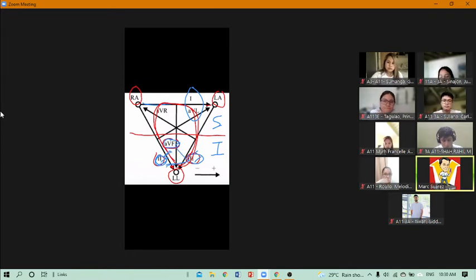It must be seen on all of these three leads. For example, if you see an ST segment elevation in lead 2 and lead 3, what does ST segment elevation signify? It signifies a probable infarct or a probable myocardial injury, right?